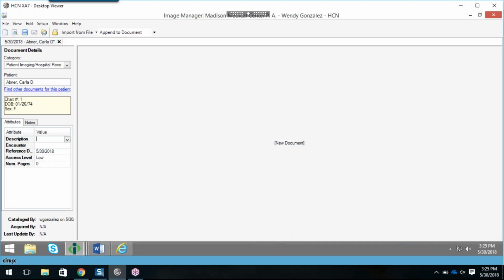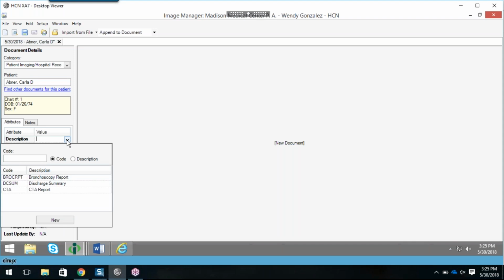A lot of our centers have descriptions where you just type in, where it's free text. And that leaves room for misspelled words. That leaves room for no consistency, some inconsistency of one user typing it one way and the other one abbreviates, for example. So what I'm going to teach you is how to create a drop-down list in your description. It definitely makes it cleaner. If you're pulling reports based on this information, it makes it more accurate, obviously. So I'm going to teach you how to create a drop-down list in your descriptions, and those are called lookup codes.